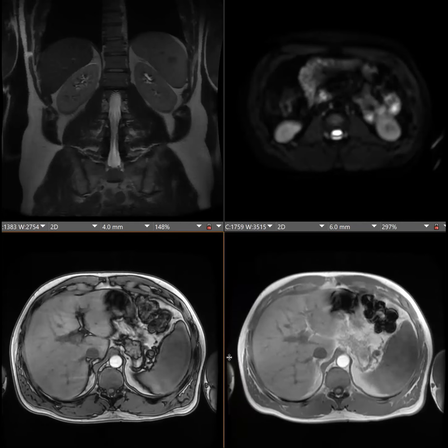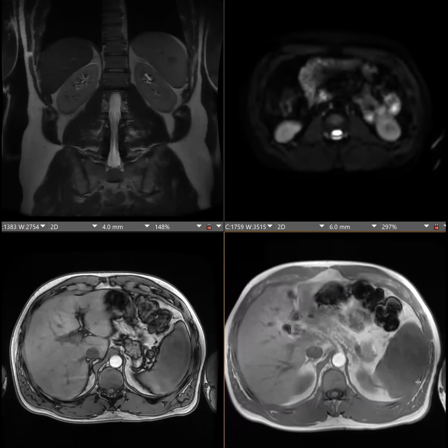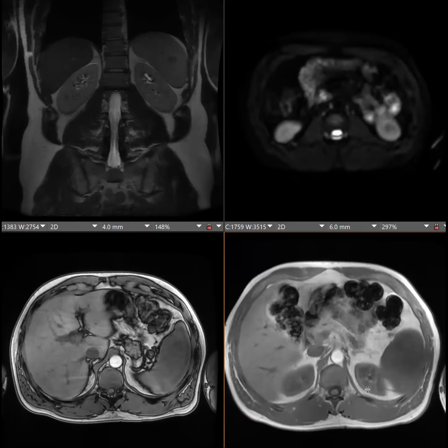And here's, let me see. Oh, it's not big. I thought it increased, but maybe the T2 is better. I don't know. It might just be fibrosis, not actual hemosiderin. Oh, gotcha. Okay, that's fair. Anyone?